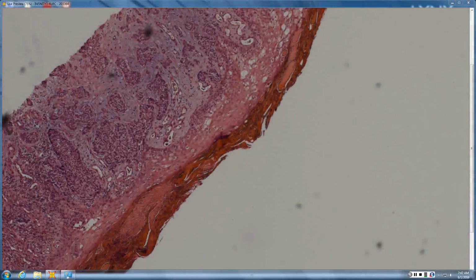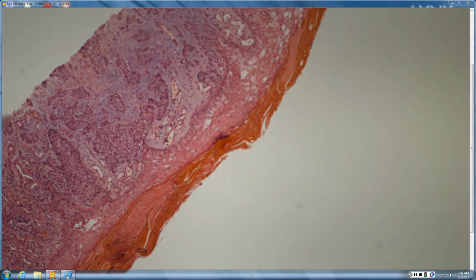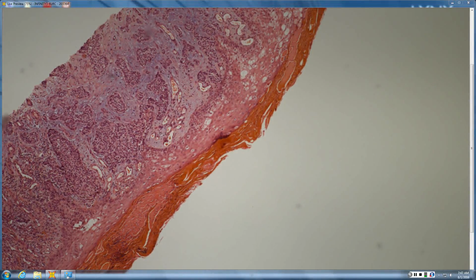So how might you tell them apart if you were going to get stains? I guess you would get diastase to tell Paget's and Bowen's apart. PAS with diastase, where you've digested out glycogen, so all that would be left would be sialomucin in the Paget's, which would remain PAS positive. So that's actually a good histochemical stain you can use.